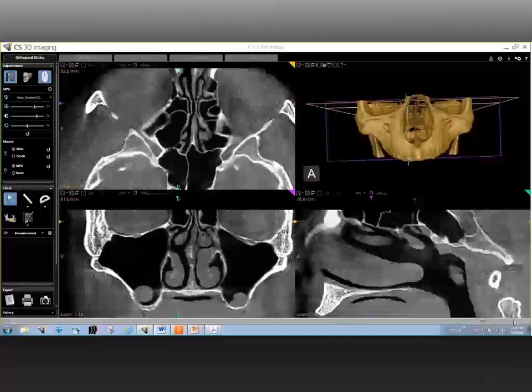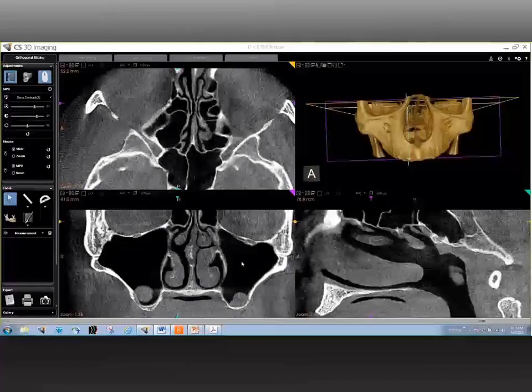But in this case, you're able to see soft tissue contrast within the sinus because the sinus generally has to be black because it's nothing but air that's in there. So in that background, there's enough contrast for the soft tissue structure or the soft tissue pathology to show up. And that is the only reason you are able to see sinus pathology.